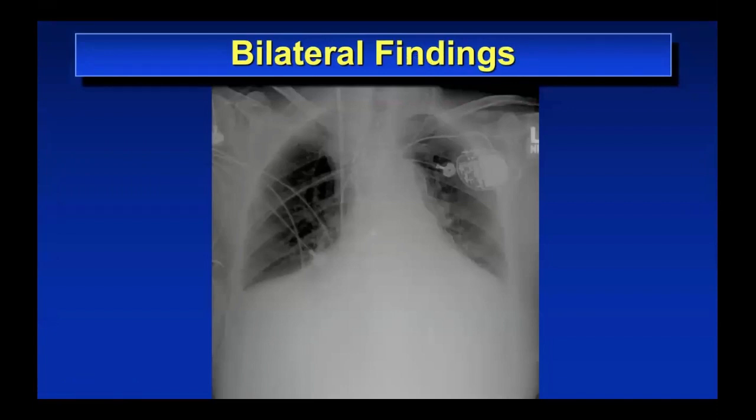Okay, how about this patient? This patient has bilateral findings. Notice that the hemidiaphragm on both sides is obscured. So we definitely see findings there.